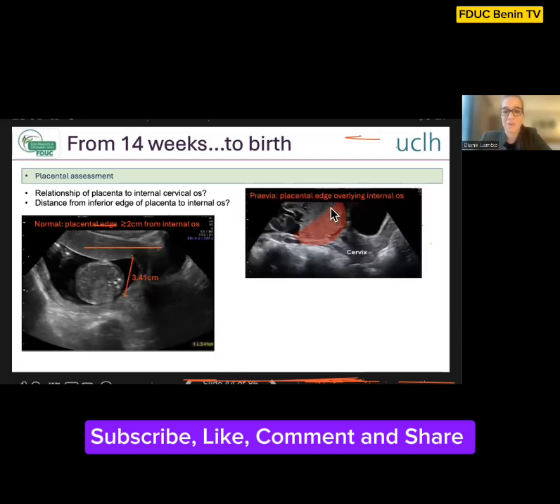Conversely, you've got here what we call a placenta previa. So you can see that, unlike with the previous image, the leading edge of the placenta completely traverses the internal cervical os, which is identified here. This is a placenta previa.